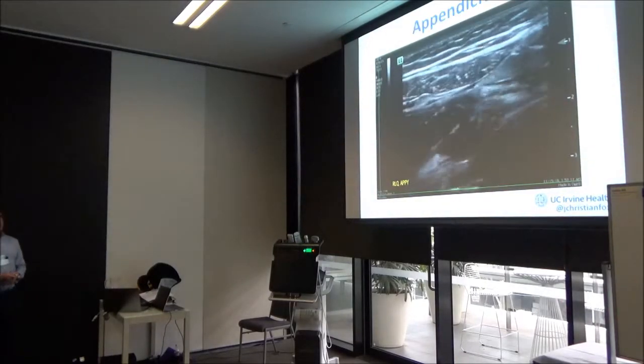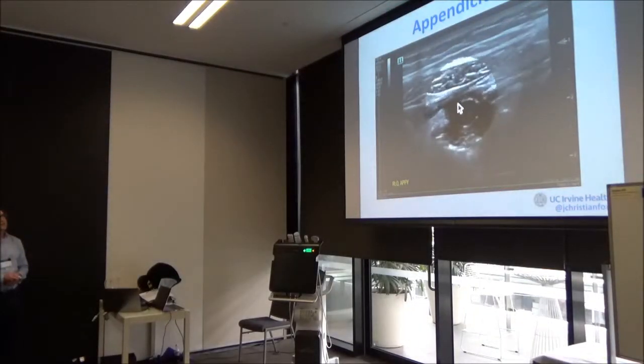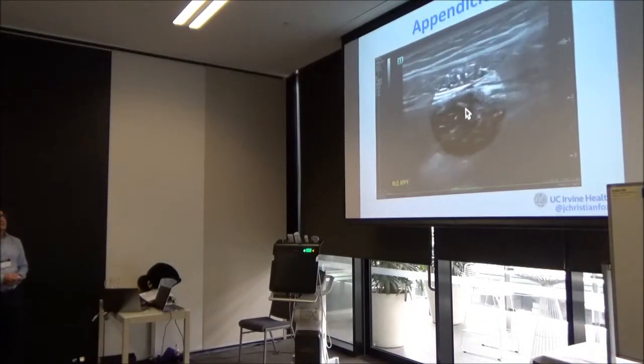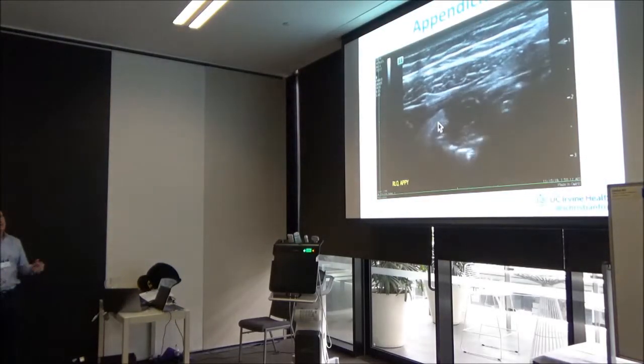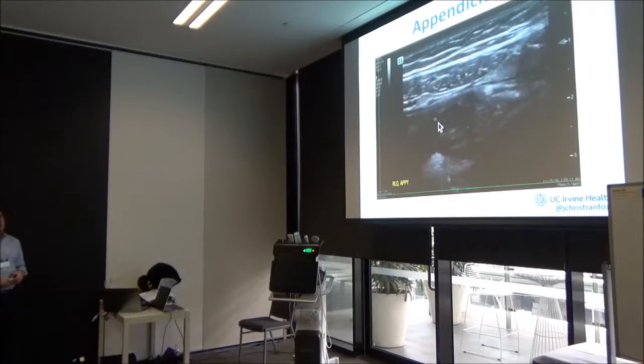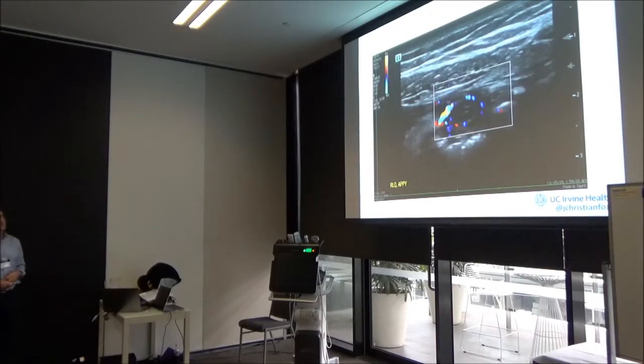Here's another patient with appendicitis, nice, several layers. You definitely see the submucosal layer here, some periappendiceal fat, right here, periappendiceal fat. I like this. This is classic acute appendicitis. With that submucosal layer intact, I think this is probably uncomplicated appendicitis, and with some nice flow around it.